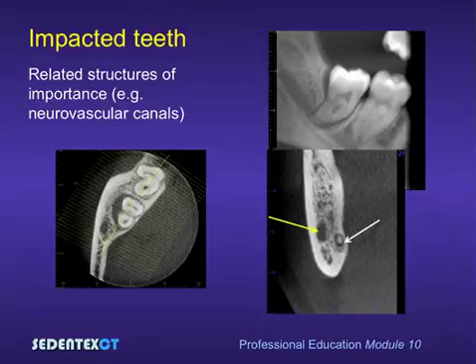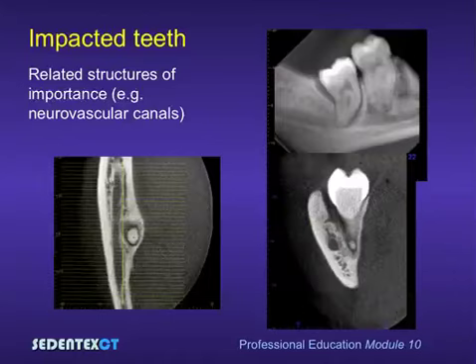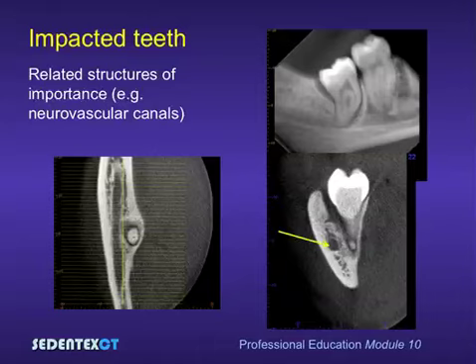But generally, it is best to upright the patient's jaw so that the inferior dental canal lies horizontally. This will give sharper images of the inferior dental canal. By rotating the volume so that the inferior dental canal is positioned horizontally, we get a sharper cross-sectional image of the inferior dental canal, as you can see here. Generally, this is good practice when preparing cross-sectional images.